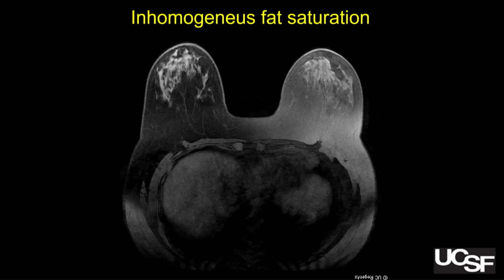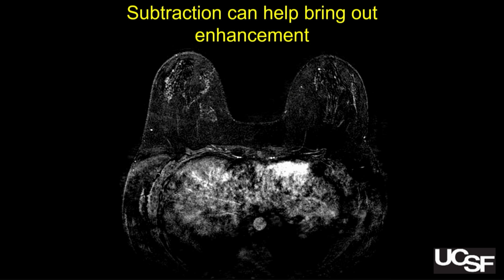And then you want to make sure that you're not turning any tissue black, because that's a problem for interpretation. In this case, the subtraction was great for bringing out the enhancement. Unfortunately, there was also a lot of background enhancement that had to be looked at. But at the end of the day, at least it's a diagnostic study.